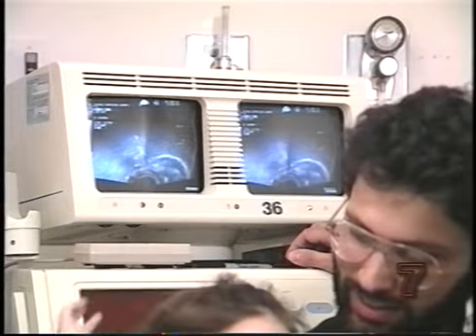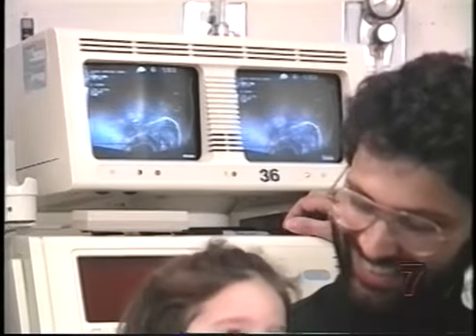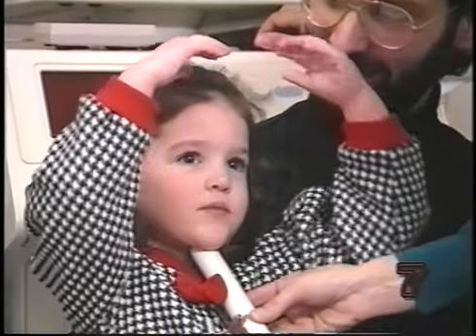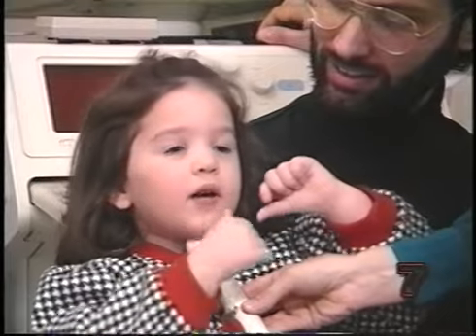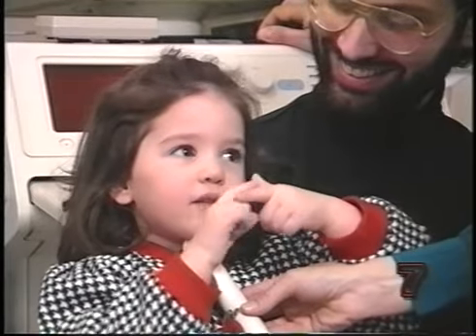Ultrasound is a unique instrument at this point in time. It's the only way we can really see cross-sectional movements of the tongue, pharyngeal movements of the tongue. It creates an entire new perspective in the way we look at the vocal tract and the way we think of how the structures move. Namely, it causes us to think three-dimensionally instead of two-dimensionally.